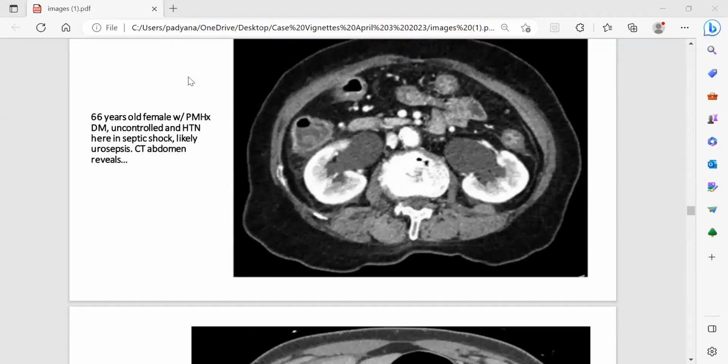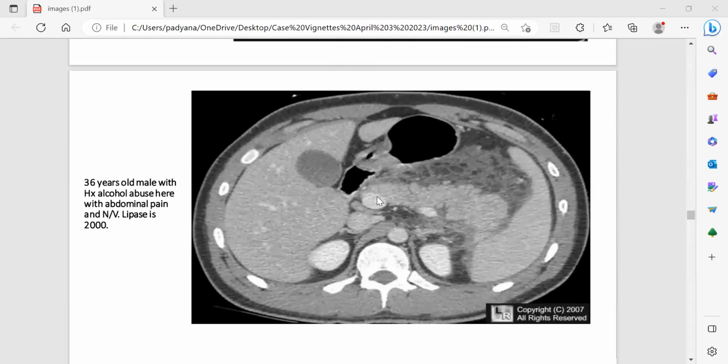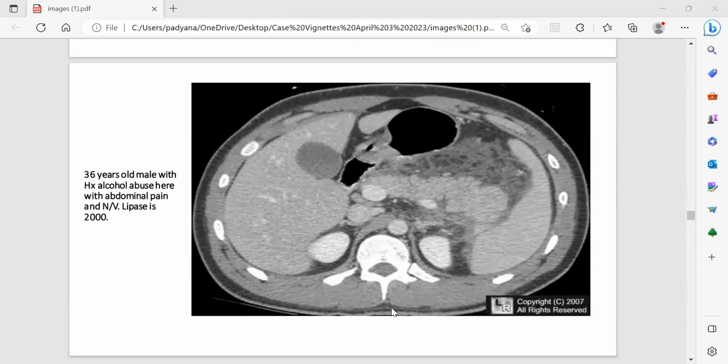Air in the liver, portal air, ischemic hepatitis or ischemic colitis. So one of these four are the commonest CT scans shown in the exam. So think about those things. Large calculus in the gallbladder. Pancreatitis. Excellent.